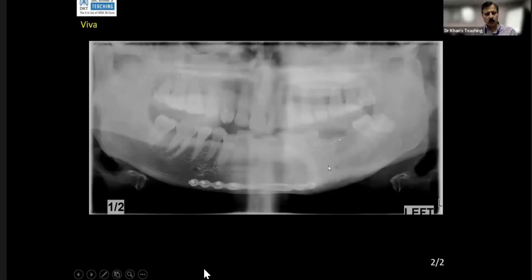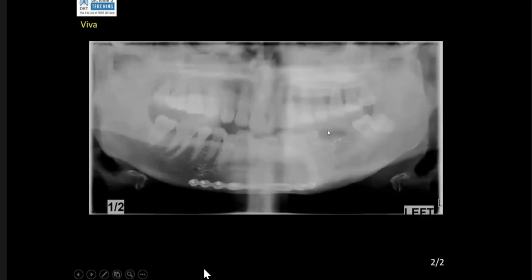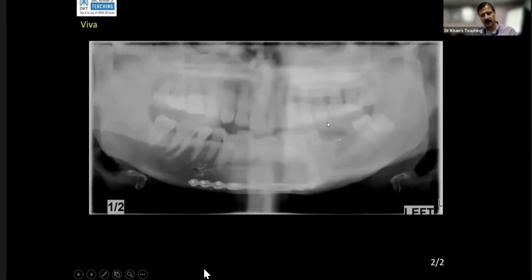Yeah, actually, this is the same patient. And interestingly, in this case, this was missed. Clinically it was evident, but radiologically somebody missed it. And then OPG, you can see it is sitting here, and this is abnormal.